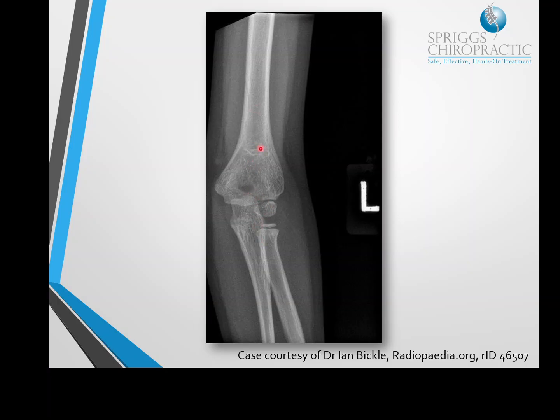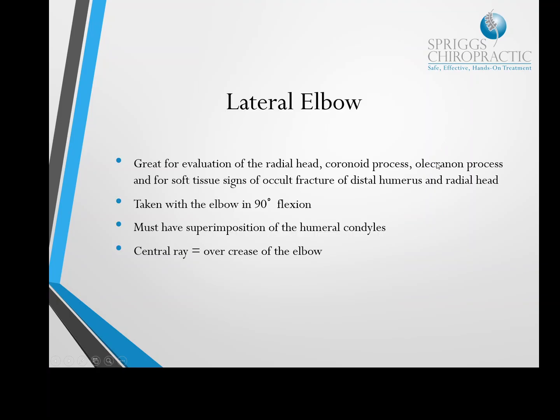There are certain measurements and angles that you can take around here to make it a lot easier for you. I'm not going to go through them in this particular lecture, because this is the normal appearance of this area of anatomy. When you go through your trauma cases, that will be when you need to know the measurements and the lines and angles that you need to measure. So I'm not going to go through that with you in the normal series.